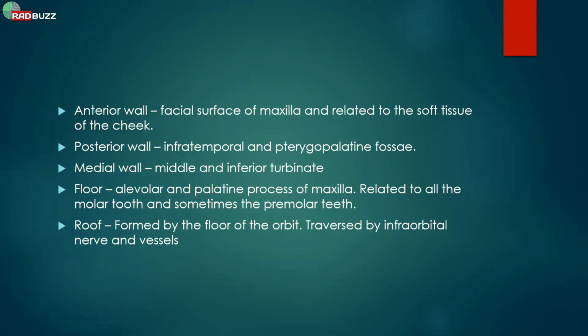It's an arbitrary space in anatomy on clinical grounds, but on imaging we can see pterygopalatine space in fossa because it contains pterygopalatine ganglion, and pathologies which are going to involve the posterior aspect of maxilla or maxillary sinus, they usually affect pterygopalatine fossa and its contents, and give very specific clinical signs and symptoms. So we need to tell properly whether pterygopalatine fossa is involved or not.